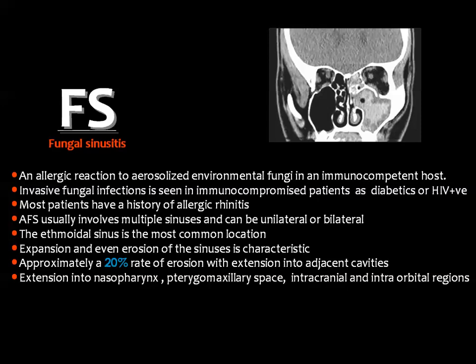An infection of the paranasal sinuses by fungus may be seen in immune competent patients and also in immune compromised patients. This is known as allergic fungal sinusitis in the immune competent, and invasive fungal sinusitis in the immune compromised. It is usually said that invasive fungal sinusitis is diagnosed by the presence of extensive bone destruction and invasion of the surrounding structures, while allergic fungal sinusitis has an expanding nature and less bone destructive changes.